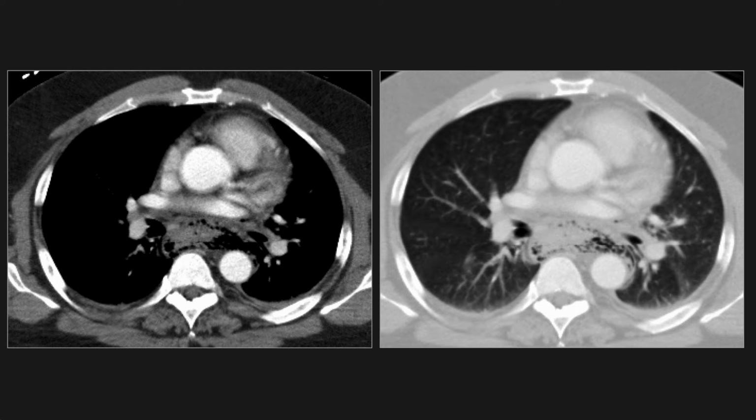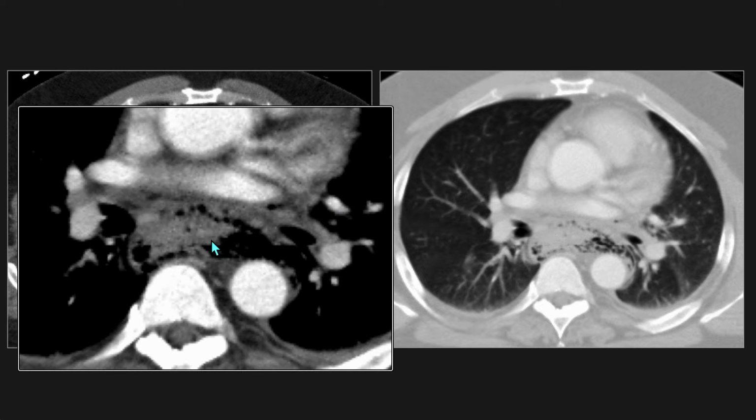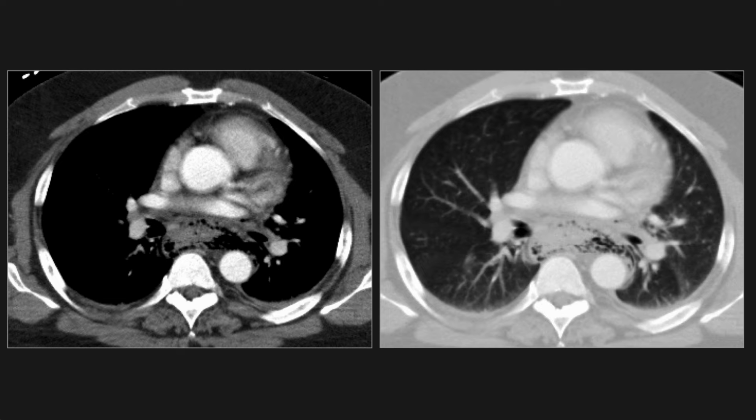Here is an example of a patient presenting urgently to the emergency department with a thickened, hemorrhagic esophageal wall with pneumomediastinum. Clearly there is a leak, and CT surgery wants us to do an esophagram to find and characterize the leak.